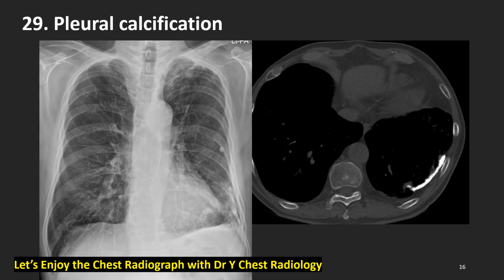How about this old man? Right side lung is relatively looking good. Relatively, not 100% okay, but relatively looking good. How about the left side? Yes, all stable TB findings here. Stable TB findings, calcifications, thickened diaphragmatic pleura with pleural calcification, linear and broad, anterior or maybe posterior.